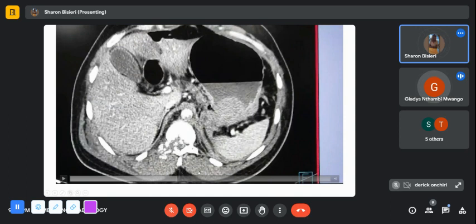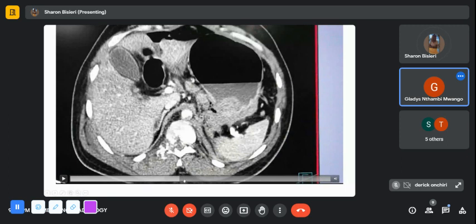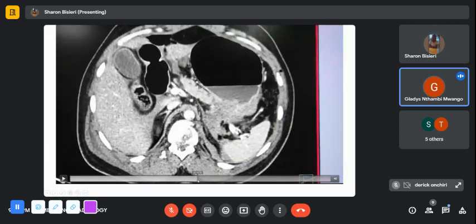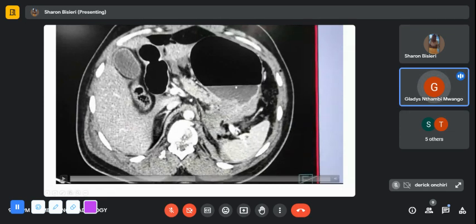The injury to the aorta was intramural, right? As opposed to a rupture. Yes, it looks like a wall hematoma. And even for the stomach, I thought there was bleeding, a little bit more intraluminal than extraluminal. But it also looked a bit contained around the stomach.